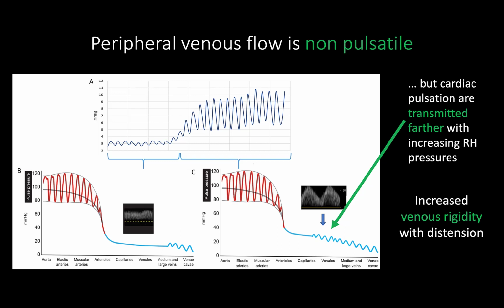While the hepatic vein tracing directly reflects cardiac pulsatility in the healthy individual, it is not the case in the distal venous system. While venous pulsatility is dependent on backward transmission of right atrial pressure variations, this transmission is usually minimal in distal organs. This attenuation of the venous pulse with increasing distance from the right atrium is related to the high compliance of the venous system.